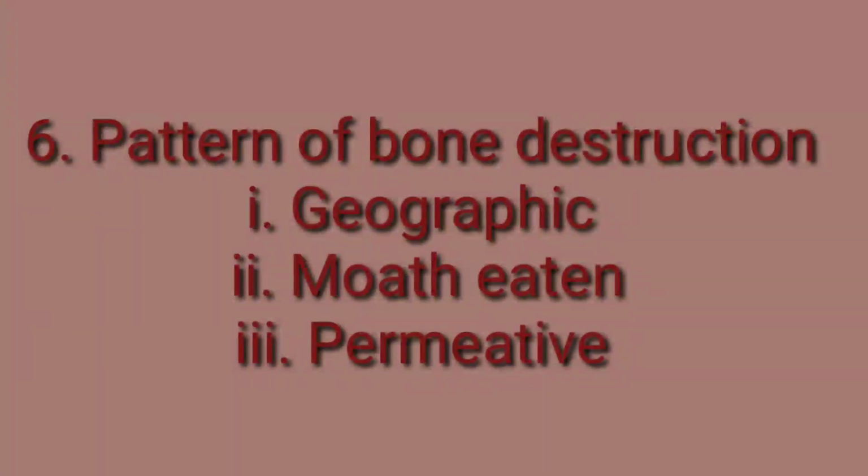geographical in appearance. Moth-eaten will look like holes with less defined margins, and this shows a more aggressive pattern, usually seen with metastatic deposits, with lymphoma and Langerhans cell histiocytosis. The third very important and worth noting point is the permeative pattern. It is a poorly demarcated pattern.